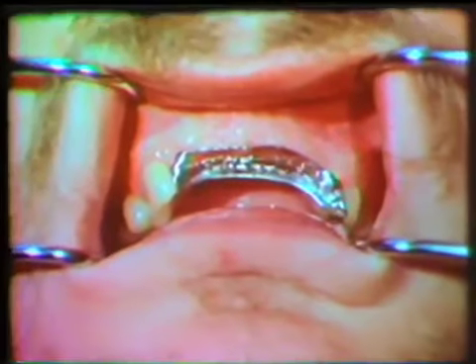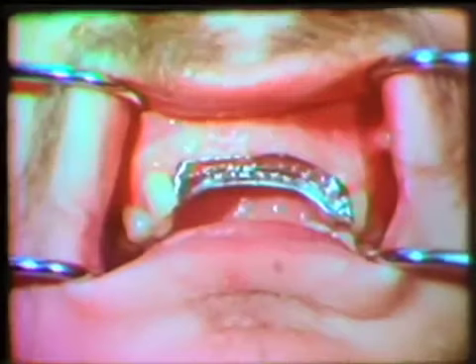The rotational path concept in removable partial denture design is effective in meeting the aesthetic and functional demands in the prosthetic replacement of maxillary anterior teeth. The rationale, indications, advantages, and disadvantages of this concept have been presented.